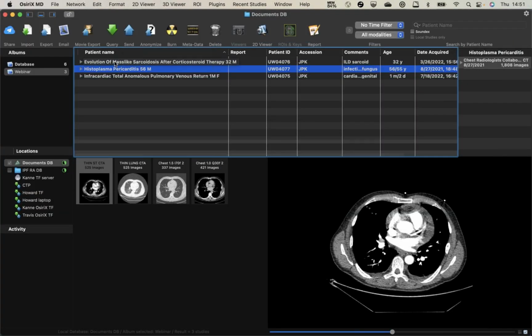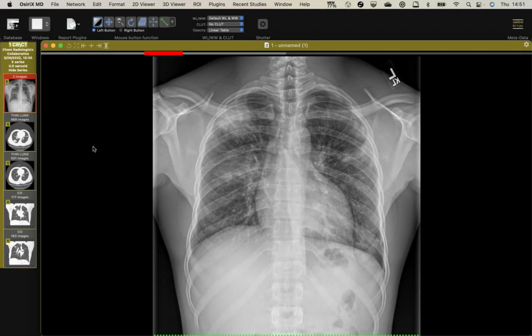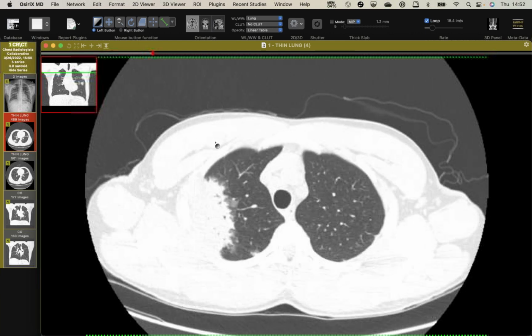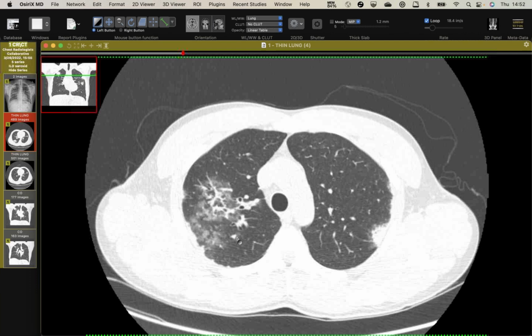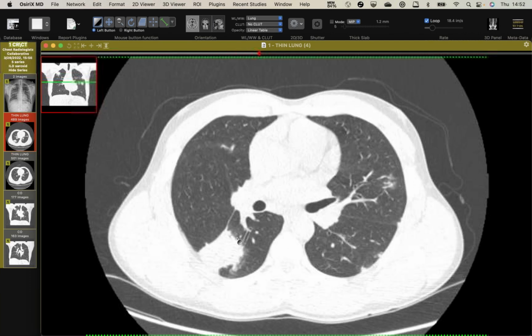And then this is kind of a cool case. So this patient presented back with cough, and you can see there's these sort of mass-like areas and some nodules in both lungs. And then had a CT scan done, and had these large areas of consolidation, kind of shaggy margins, a little bit of ground glass around them, and very discrete air bronchograms.